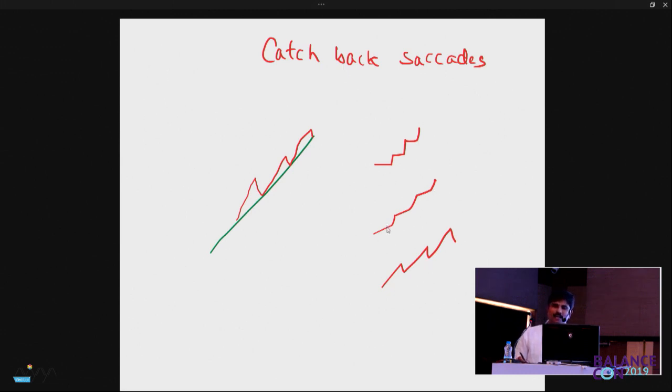This, you can see this angle, this is an obtuse angle. Can you see this? Here you see there are acute angles, correct? So if you see obtuse angles, they are catch-up saccades. If you see acute angles, they are called, what are they? Catch-back. No, I want a bigger sound. I know we are very near to lunch, but what is this called? Catch-back saccade.